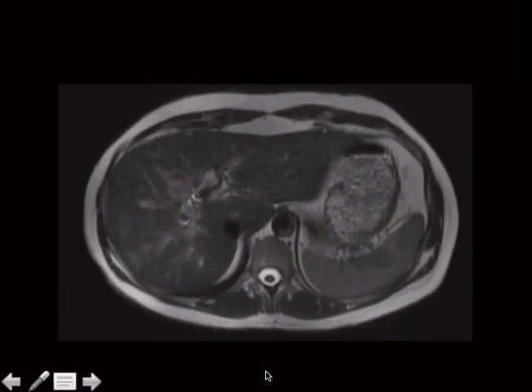All right, how about this one? It's a great case. T2 through the liver, all this stuff. What is that? It's edema, and it's periportal edema. That's what that looks like. And you didn't show me the IVC being really big. You're not showing me the heart.